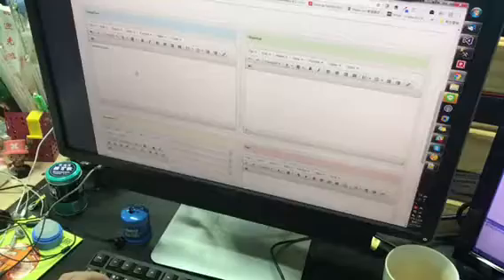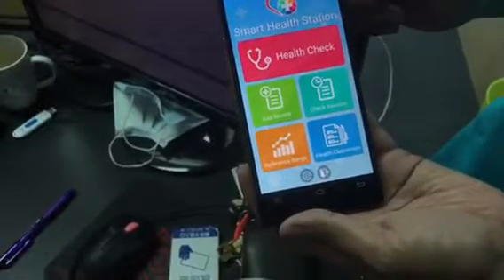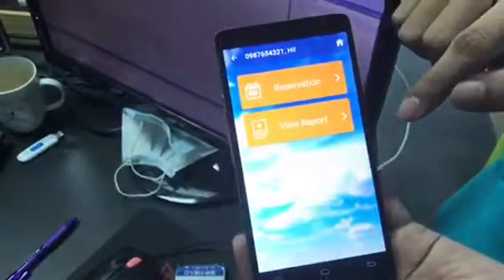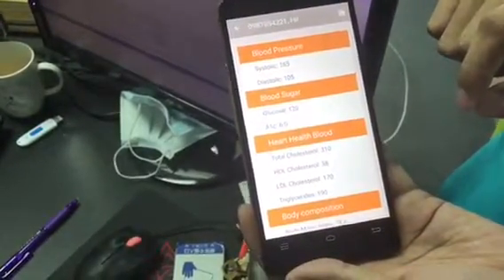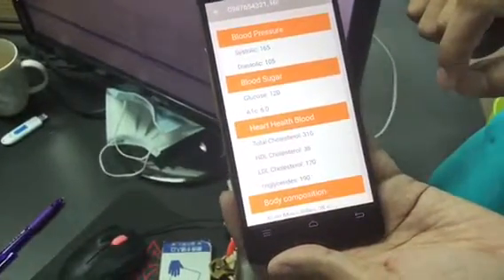So after that, all the reports and the feedback from the doctor can be printed out like a report, and even more, it will be sent to this app, the user's app. So this is how they can check the report. Here is the view report. You can see the final result, and the document can also be downloaded here. So we are not finished yet, but the scenario could be like this.